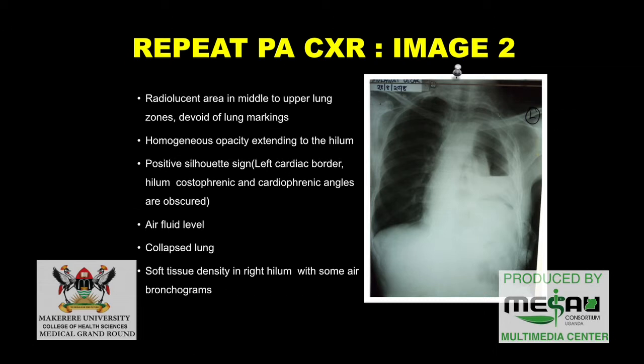This soft tissue density with some air bronchograms is most probably the remaining lung, or the collapsed lung. The radiolucent area, which is devoid of lung markings, is more probably a pneumothorax, free air in the pleura. And there is an air-fluid level, so we are still having some fluid in this patient.